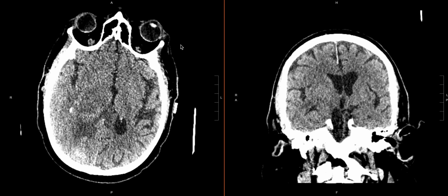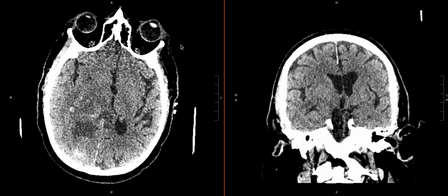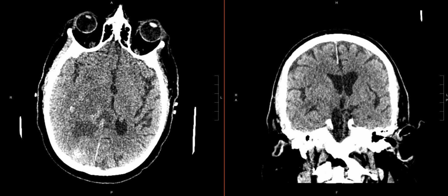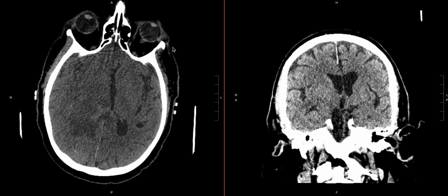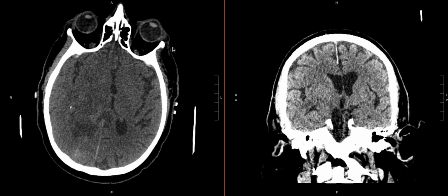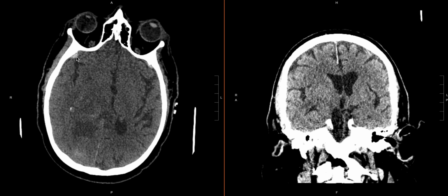What we're going to do first is window for success, mainly because the standard brain window we're using here is going to make it very easy for us to miss blood products. So what I'm going to do is use one of our presets. This is a 60-160. 60 is the level, 160 is the window, and already with that preset, we see that these blood products here, this is actually where the subdural is, become much more obvious compared to before.